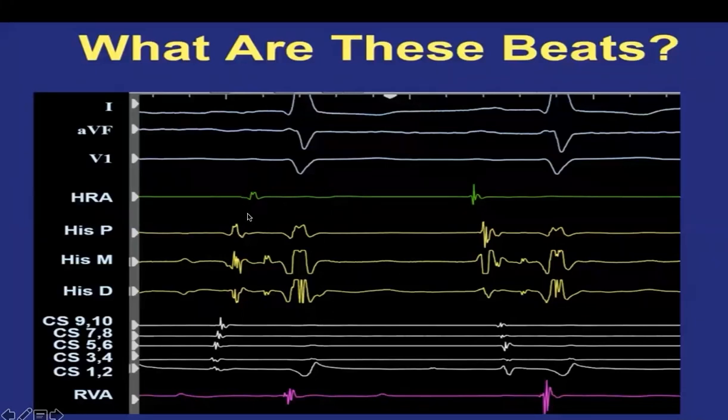While this one is showing that the early activation was the distal coronary sinus, and the atrial activity is earlier here rather than the right atrium, while here in the sinus rhythm we get the activation early in the right side, earlier than the left side. Because if you put a line here, you will find that this one is earlier than this one, starting our 0 point.